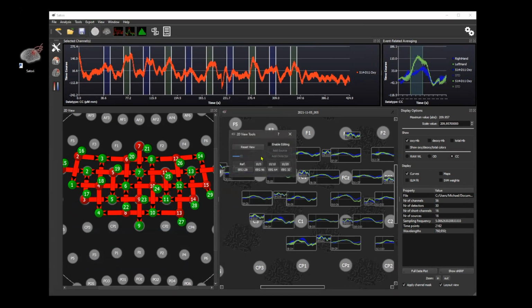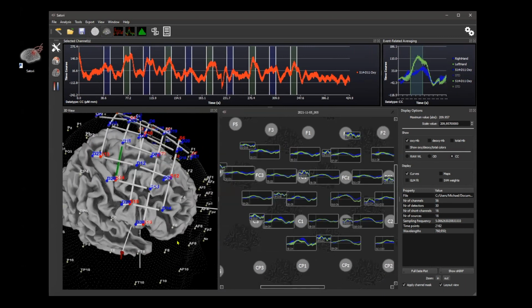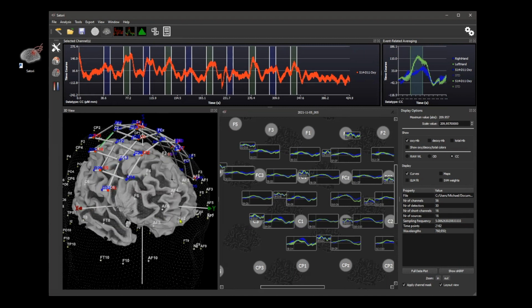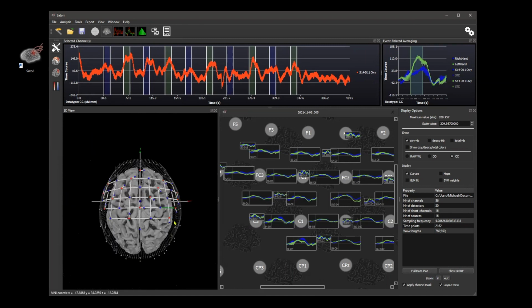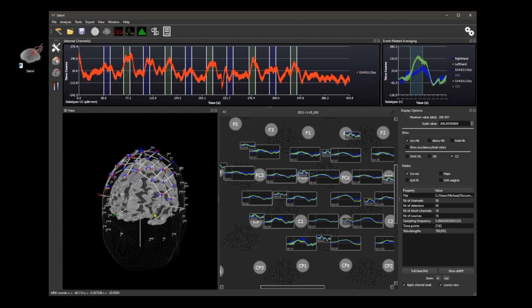Okay. So other than that, you have different view options for the 2D view tools, but I will show you more details in the 3D view, because this is actually a bit of more interest. If you want to go for a standard view, you have some shortcuts. So you can, for example, go to different views in the front. So some keyboard shortcuts that you can find in the user's guide that you can easily come back to a certain view.